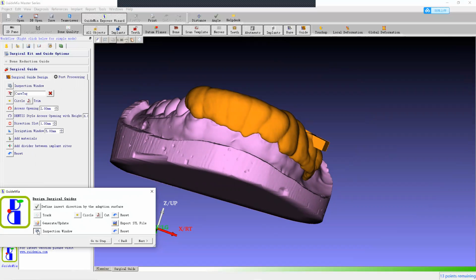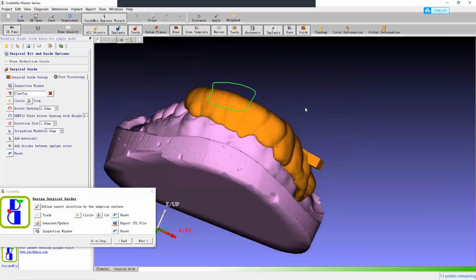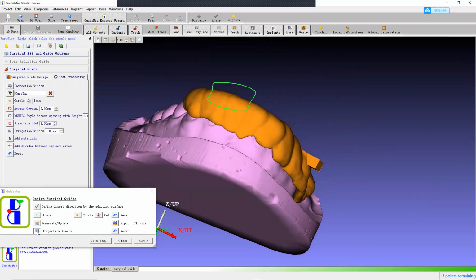You click to get into the function, then you draw an area where you want to cut. Or you can cut this way, or you can cut a different direction, it doesn't matter. So you always go like that. Click, enter the function, draw the profile, then finish.